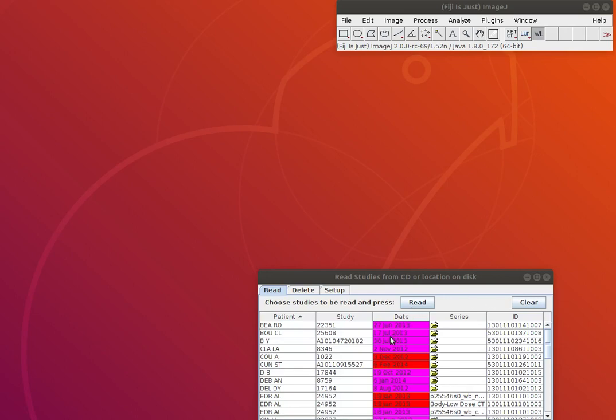To see disease progression, we have to look at the same patient at multiple points in time. I'll take these 3 studies and pretend it's the same patient, which is clearly not. So let me bring up the first study.